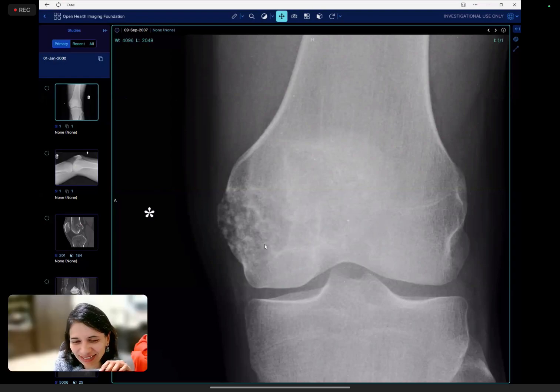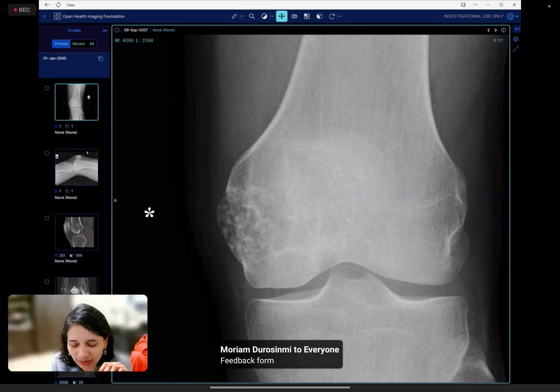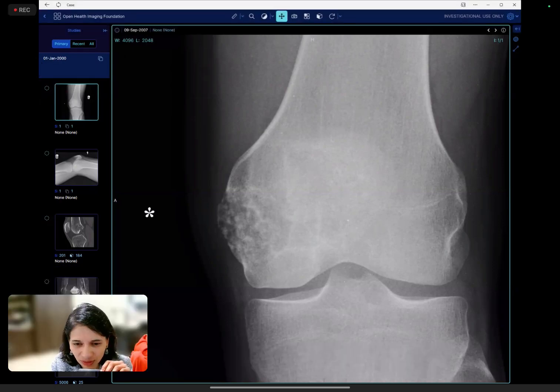Because you described everything, and I thought, she's going to just say it's chondroblastoma. Then I thought, oh, what happened here? And the other thing is GCT in less than 30 is very, very unusual. There are case reports. I'm not saying it will never happen, because you do get one case report here, one there. You can get them. But as a rule, if you are going to describe lesions to me and say in a 20-year-old, GCT will not be in the top differential, I'll completely agree with you.